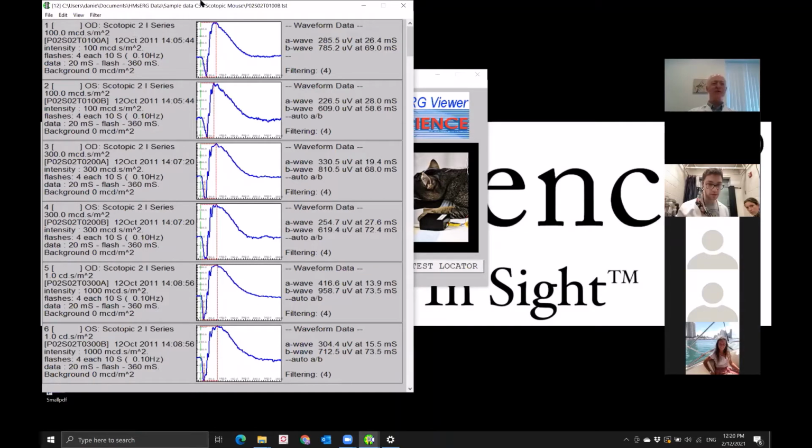If there was some noise on all of them, we have the ability on a global level to filter that data. Our system has, and most systems do have, the ability to do certain notch filtering. In our system, we have a 60 hertz and a 50 hertz notch filter. We also have what we call spike filtering, which is basically looking at a change in data in a very, very short period.